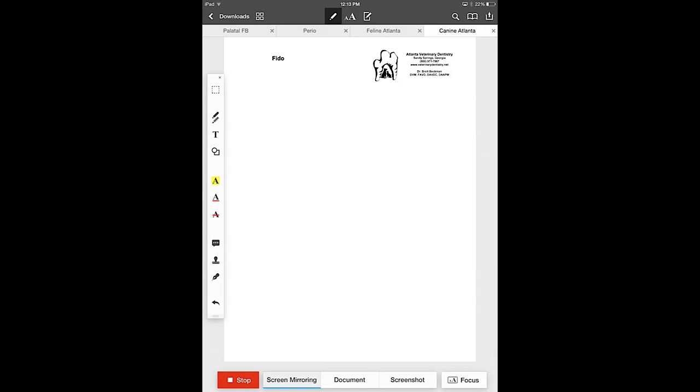So if we're going to utilize this to add some pictures and radiographs to this client education sheet, all we do is tap that little square up there at the upper left-hand corner of the annotations bar, which will highlight that in a light gray with a little blue line beside it. And then we can go down and tap wherever we want that picture to be, or a close approximation to where we want the picture to be, and hold, and that brings up a hidden annotation bar.